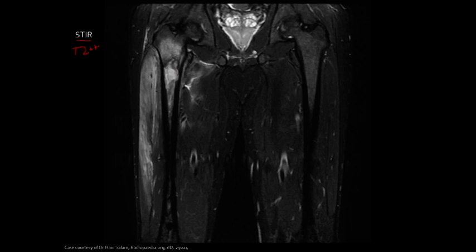So there's that inflammatory focus, the infection in that area, and we can see where there's a lot of swelling. In fact, there's some muscular change, wispiness and inflammatory change in that muscle as well. So the infection is either wholly in the bone or it's in the muscle as well, or possibly it's in the bone with some inflammatory change due to just the irritating nature of it.